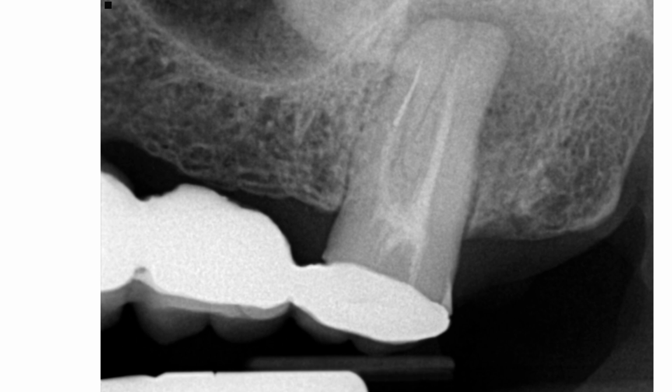Well, if I had to do it, I would say I'm clearly seeing radiolucency in this area, and this would be the approximate, perhaps the border of that radiolucency. So let me ask you another question. If you didn't agree with me, what was your extent of the lesion? And what about the alveolar crest? Does it appear intact, or is there a big defect along the alveolar crest?